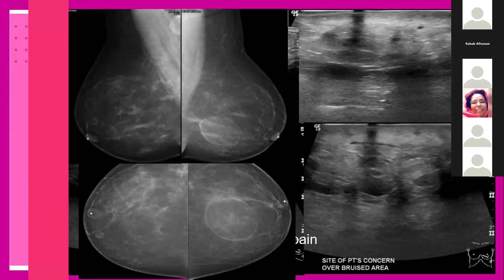So the lesson here: to reach a diagnosis, you have to search in the patient's file for previous studies to compare and explain. And we found, I had missed the ultrasound image for that cyst in the previous study. She had bilateral multiple fat necrosis, chronic fat necrosis, forming oil cysts. That oil cyst ruptured and resulted in acute fat necrosis in her left breast. Okay?